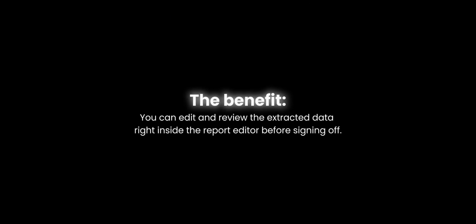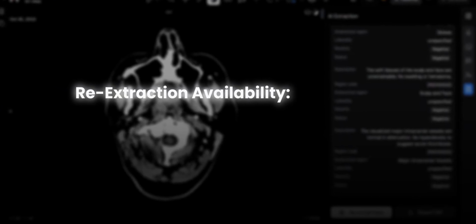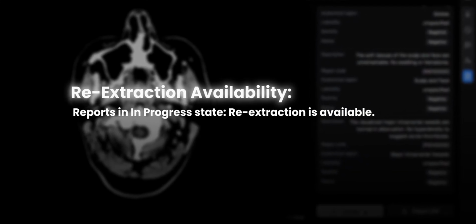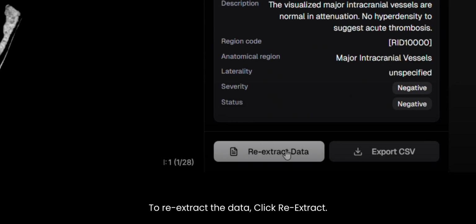The benefit? You can edit and review the extracted data right inside the report editor before signing off. Re-extraction availability. Reports in progress state, re-extraction is available. Reports in completed state, re-extraction is not available. To re-extract the data, click Re-extract.